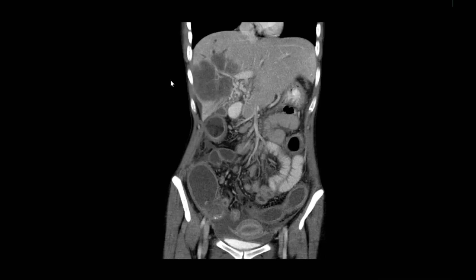Okay. So to make it easy, we have diffuse large bowel thickening, narrowing, a dominant structure here, ascites, and local lymphadenopathy. We have a mass here in the cecum and the ascending colon near the TI. This is the TI. So it's showing a mass with calcifications, ascites, and we have large hepatic lesions. So in summary, we have colitis with masses and liver lesions. This is my summary.